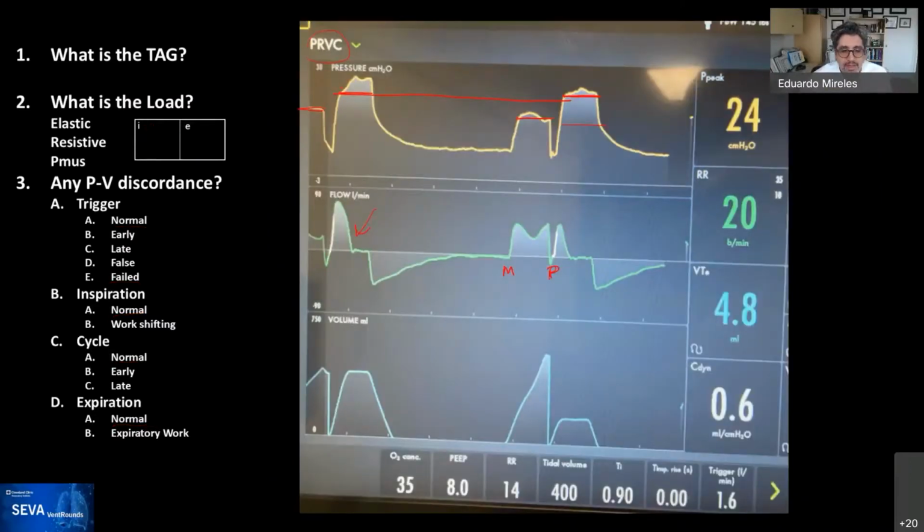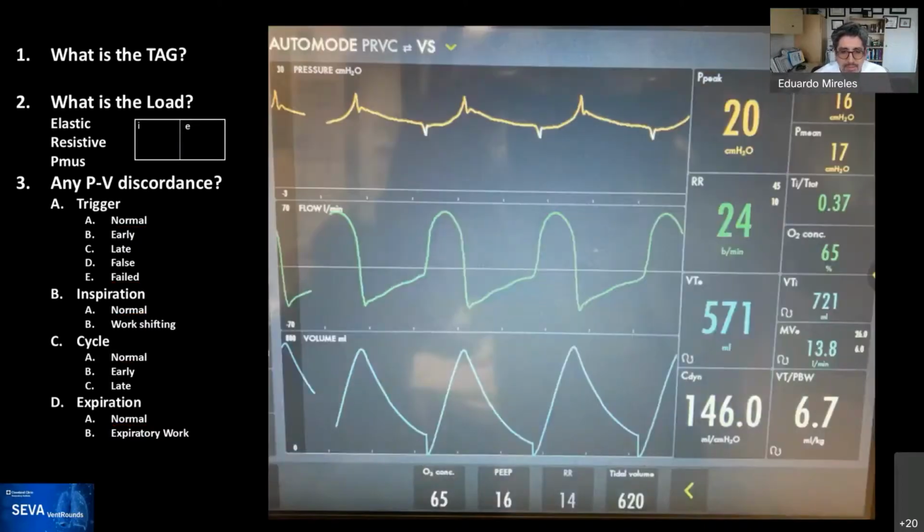This one, I just use it as an example for you to see. I put this one, which is also an adaptive mode, but it's a little bit more cumbersome. So anybody wants to read this one? Have no fear. I can go for it.